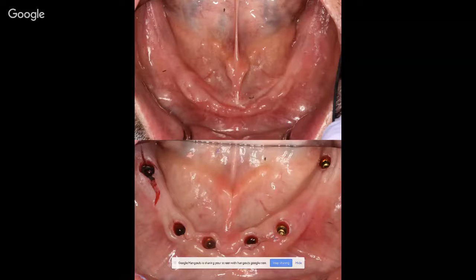So at this point, again, in 2016, I was very pleased, but I want to make sure that the accuracy of my surgical guide, even just using a pilot drill guide and my bone guide, was just as accurate as I worked up with Corey Glenn in the software. So I took a post-op CT scan, and I imported it back into Blue Sky Bio Plan as a scan appliance.